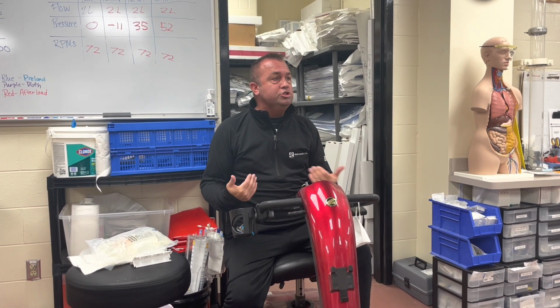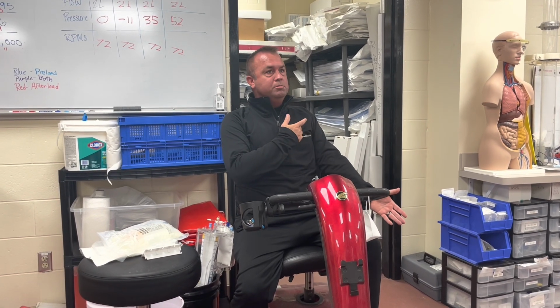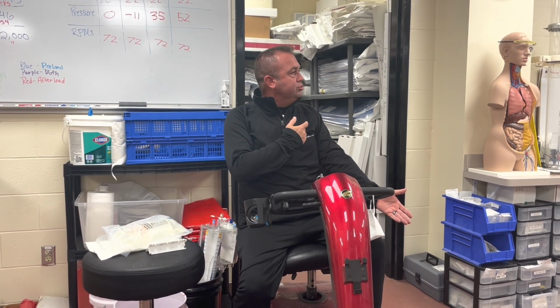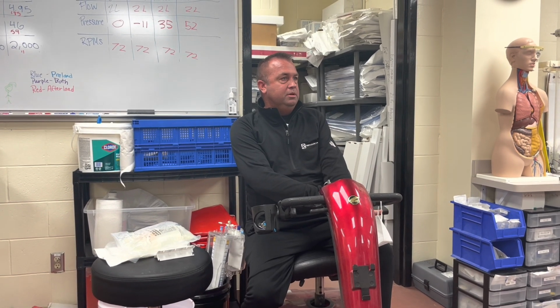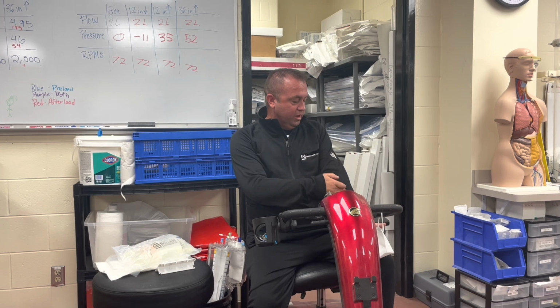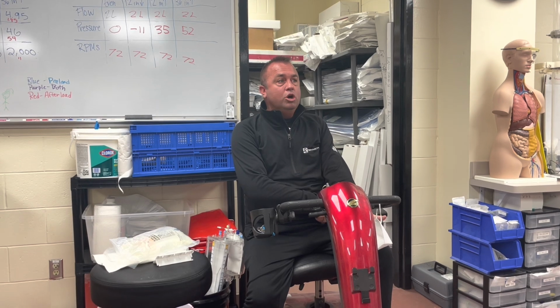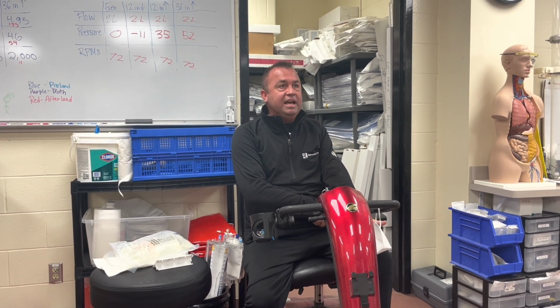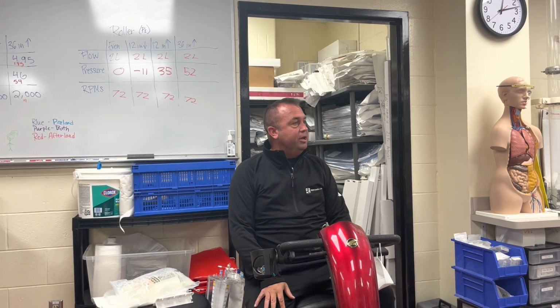There are other places to measure pressure as well. Generally speaking, the further proximal you go towards the heart, the larger the vessel, the better pressure reading we're going to get, because the less likelihood that that vessel is going to be dampened. Does that make sense? So if our radial pressure is dampened, you'll see a surgeon or an anesthesiologist once in a while put in a brachial pressure line. Even better than that, oftentimes they go and put a femoral line in because of the access, and it's big, and it has a great big vessel there that's not as easily dampened.